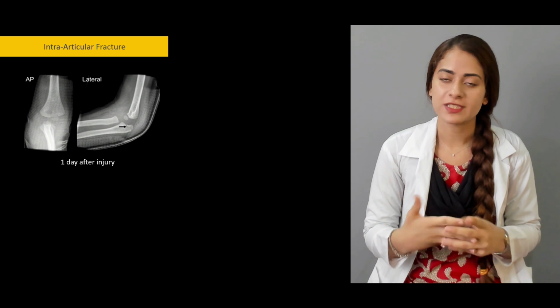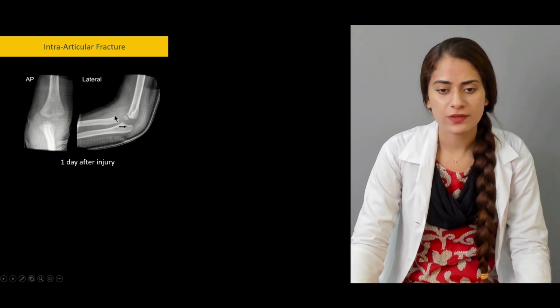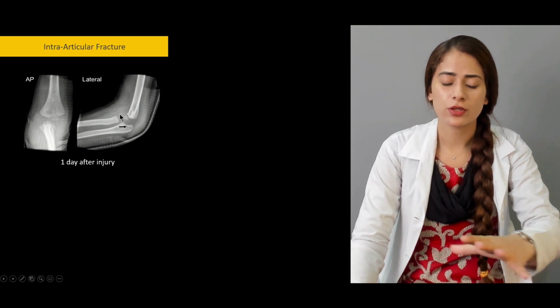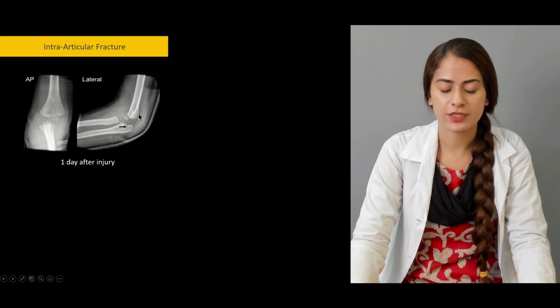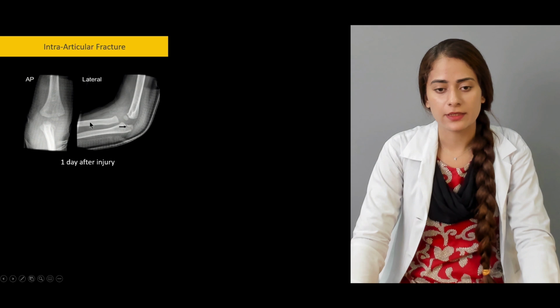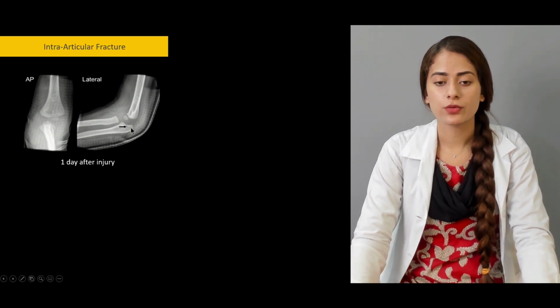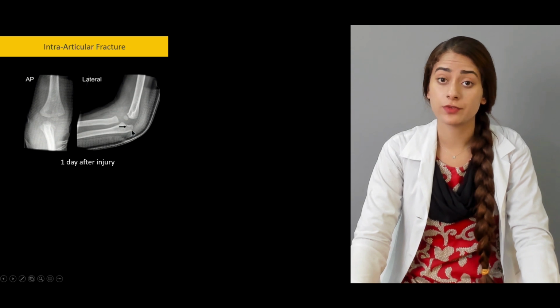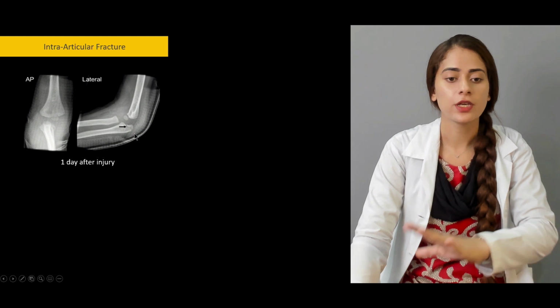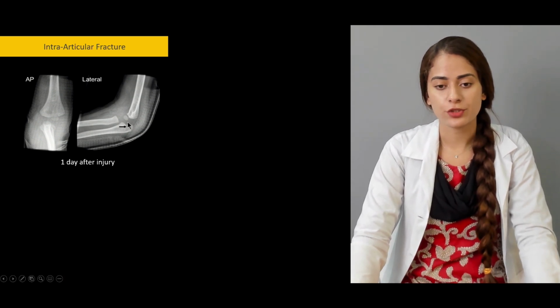People mistake it for an isolated fracture because not a lot of attention is paid to the radius here, which actually looks pretty normal as it's in line with this ossification center. This fracture is relatively prominent, so people mistake it for an isolated fracture, which we have discussed. So this is the day 1 injury.